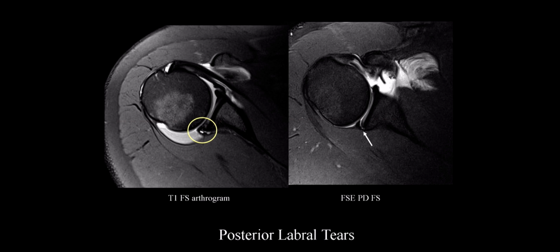And here is showing you multiple different reasons why you're very confident this is a labral tear. Very carefully, you can see that there is detachment between the triangle itself and the glenoid; you can see there's tracking of fluid. And then in addition here, you see a small focal multiloculated fluid collection. So this is your paralabral cyst.